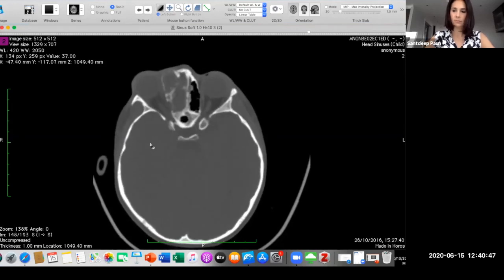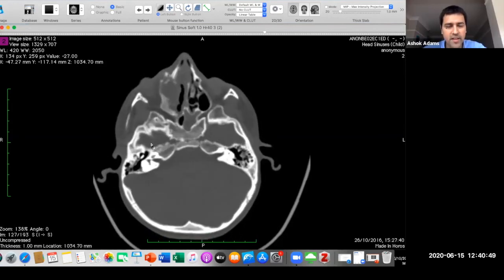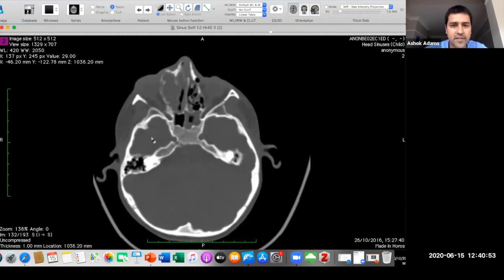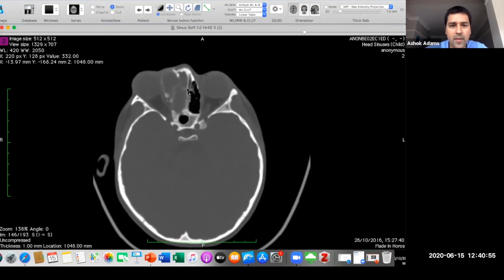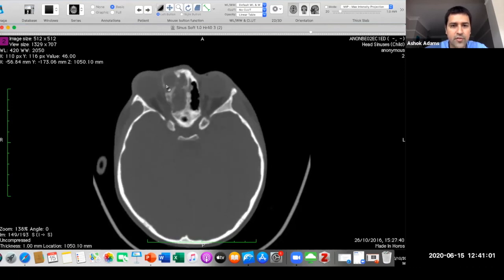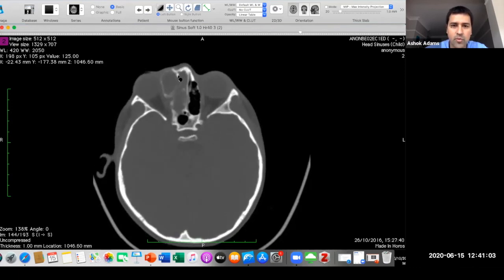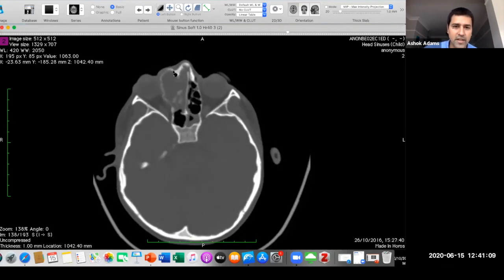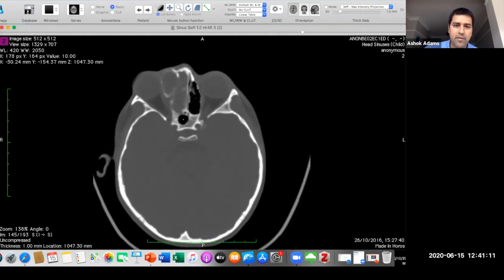So this was a young child who presented. I think it was a query whether this was a preseptal and orbital cellulitis. The thought was this is all an infectious process, but actually, with this child, you can see the sinus is abnormal, but there's some bony remodeling here. So I put this down to an acute infection, but actually this is a long-standing process with some bony remodeling.